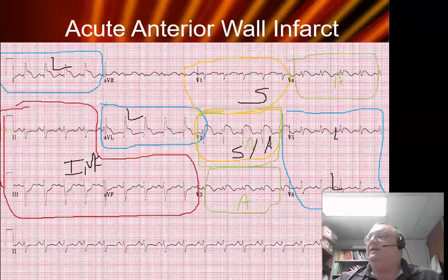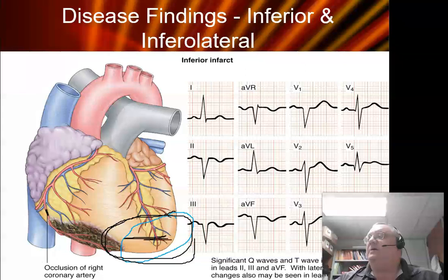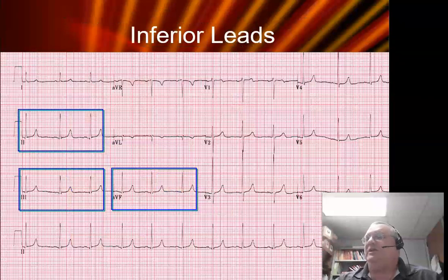Relating that back to the heart, it's the inferior wall, but I probably have some of this going on right there. So his damage is probably because of some sort of blockage in this general area of the heart. What can I expect? If this whole area gets irritated, would I expect that patient to go into ventricular tachycardia? Would I expect him to become shocky? Absolutely. Does this affect the right wall of the heart? Probably, or more than one vessel could be in trouble at this point.